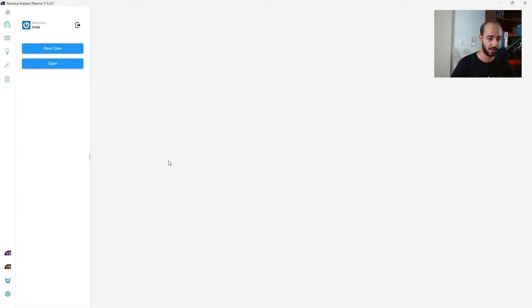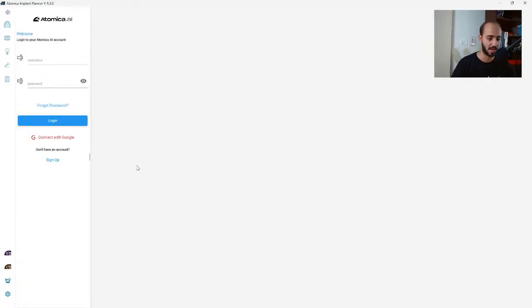So to make it easy for those who did not start with Atomica, let me sign out first to help you see how to access our software. This is the first UI you're going to land on once you start the software, the Atomica Implant Planner. To have access to it, you either sign up from here, or if you have a Gmail, you can connect with Gmail and you will have immediate access to the software. So let me connect my email pretty quickly.